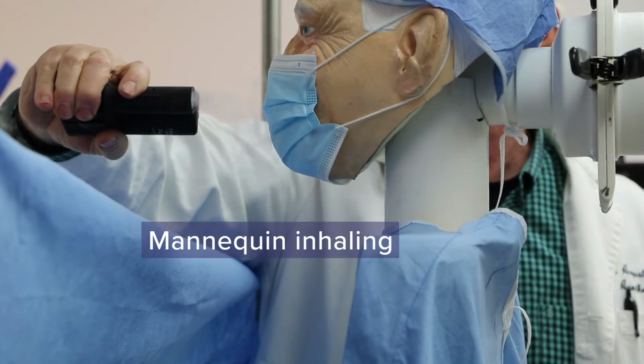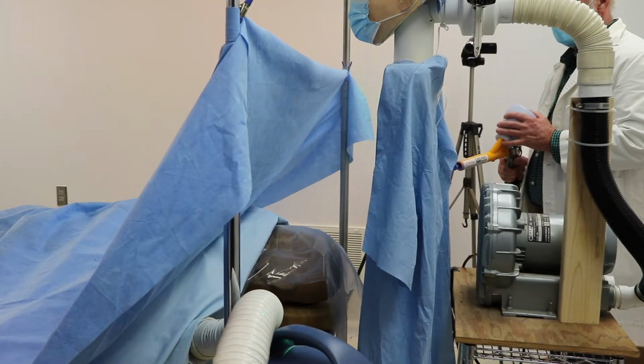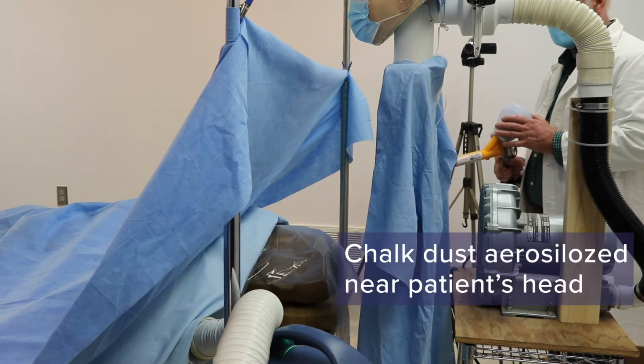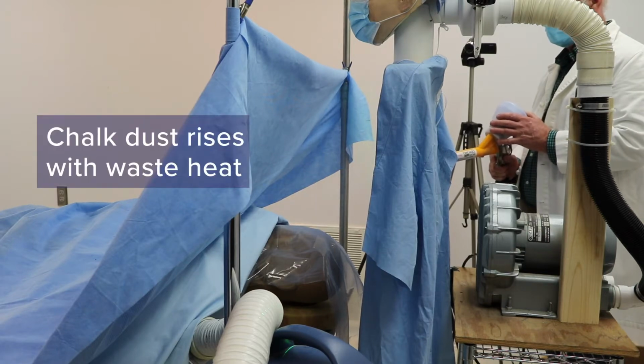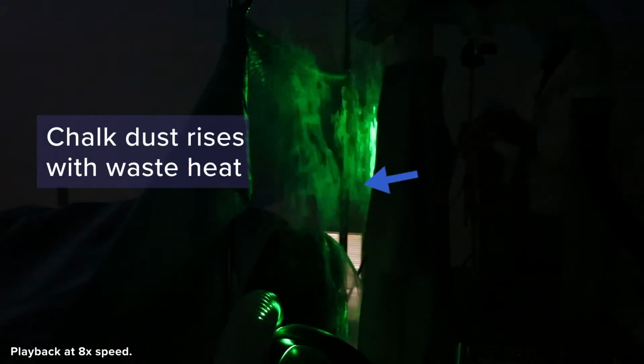An inhalation simulator is operating. An upper body forced air blanket is warming on the high setting. Chalk dust is aerosolized near the patient's head under the anesthesia drape. It is sprayed 10 times from a consistent angle, well below the anesthesia provider's breathing zone. The air currents of rising waste heat are easily visualized with a green laser.